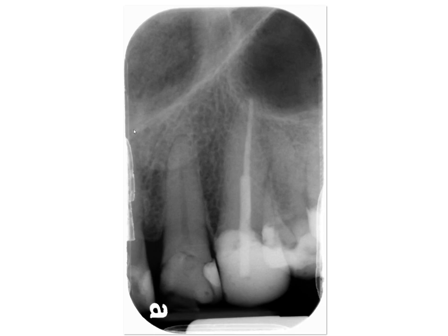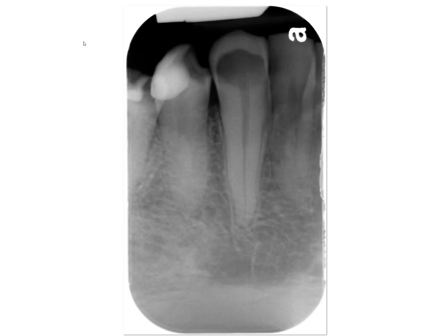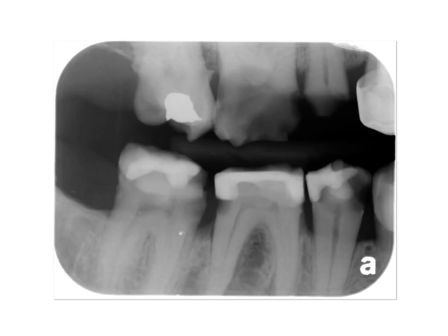Here we have a canine PA. This is the nasal aperture, and that's the floor of the maxillary sinus. A mandibular canine PA, nothing in particular. This is the inferior cortex of the mandible, trabecular bone. Bite wing. Let's see. Besides what we've already said, alveolar crest, there's not a lot of structures we can see.